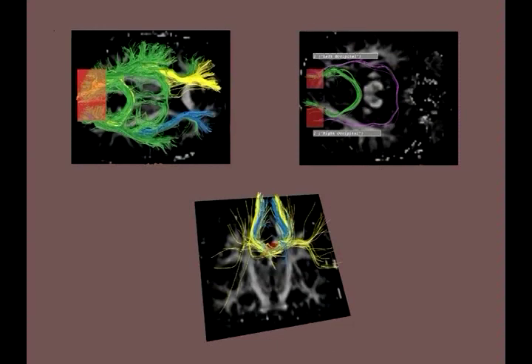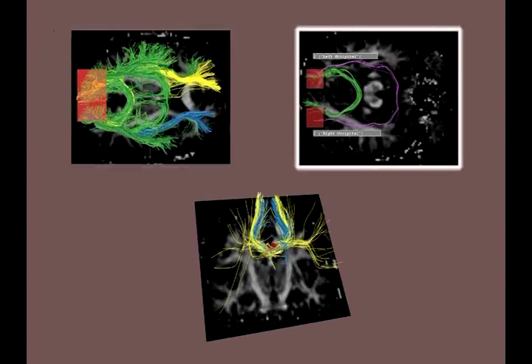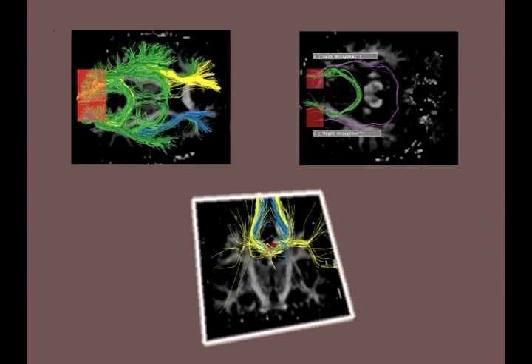In summary, we have shown how our system can be used to explore known anatomical connections, to investigate candidate anatomical connections, and to compare different path tracing algorithms.